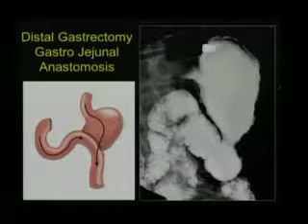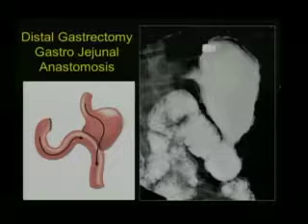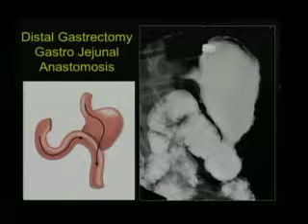Sometimes the technique is not easy to perform because this area is a little bit narrow. But we have to wait, and in some cases we have to put the patient in upright position in order to see the contrast flowing from the proximal stomach to that area. Okay. Who is going to describe this image?